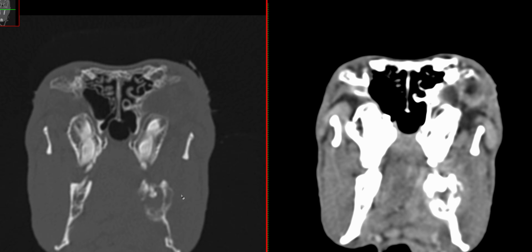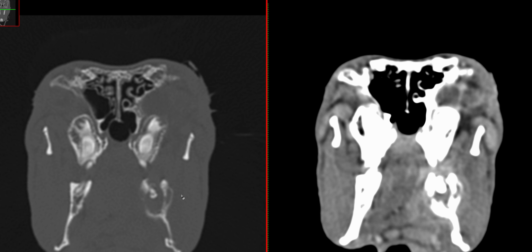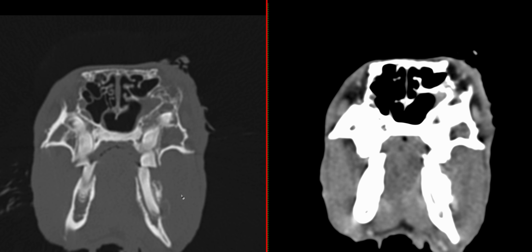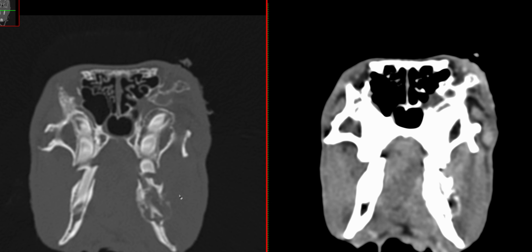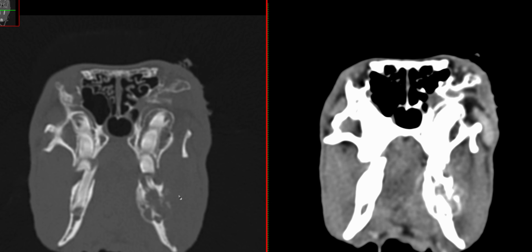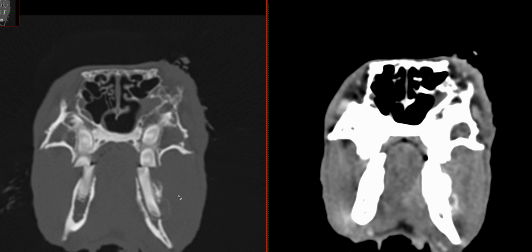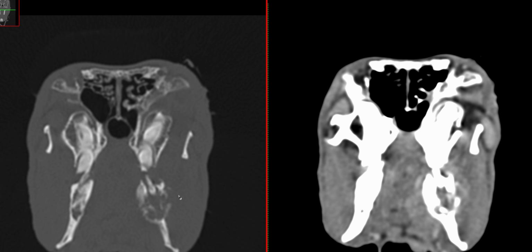So we have 2 abscesses, or granulomas, that involve the mandible, and this can definitely explain the pain that the rabbit has. Also, we have to remember that the trigeminal nerve runs at this level, so it is possible that the trigeminal irritation from this process, or even some impingement of the nerve, can cause some degree of oral pain in this rabbit.